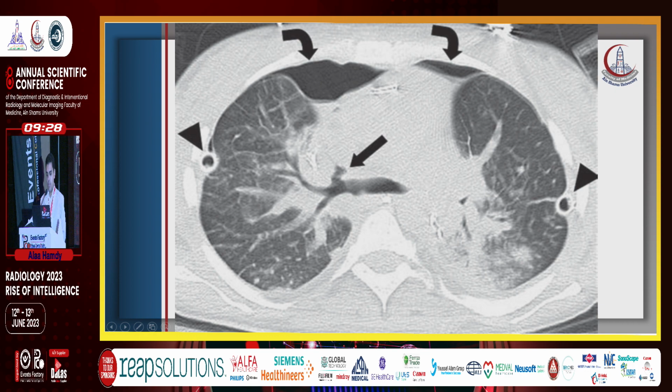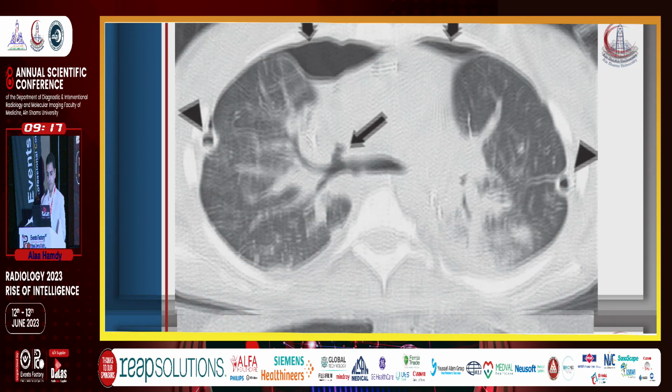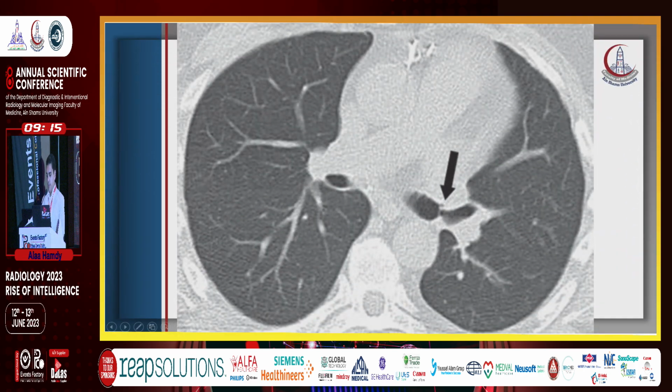We have here a focal defect at the right bronchial anastomosis with extraluminal air, and thus the diagnosis was dehiscence. Also, we have here left lower lobe pneumonia with consolidation and atelectasis. A 36-year-old man developed bronchial stenosis 6 weeks after bilateral lung transplantation.